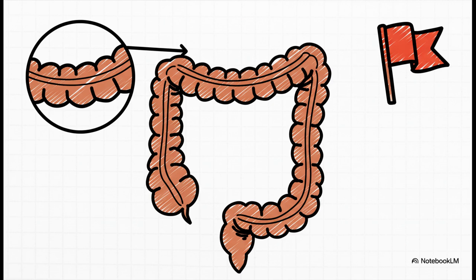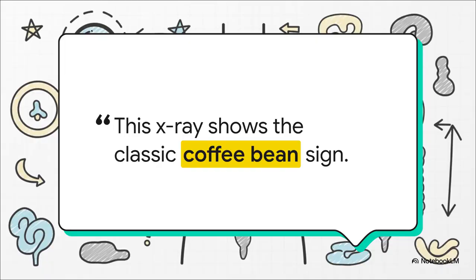Next, large bowel obstruction. This time, we're looking at that outer picture frame. If the colon is ballooning out past 6 centimeters, you know there's a blockage. And the giveaway here is that even when it's really dilated, you can usually still see those telltale haustral folds, those little pouches.